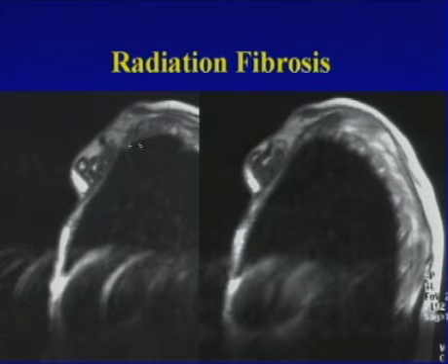Here's sagittal imaging. Again, I can't really make out the subclavian artery and vessels, subclavian vein, excuse me, and I can see there's a diffuse soft tissue filling this costoclavicular space where I should see, again, distinct fibers. So this is classic for radiation fibrosis.